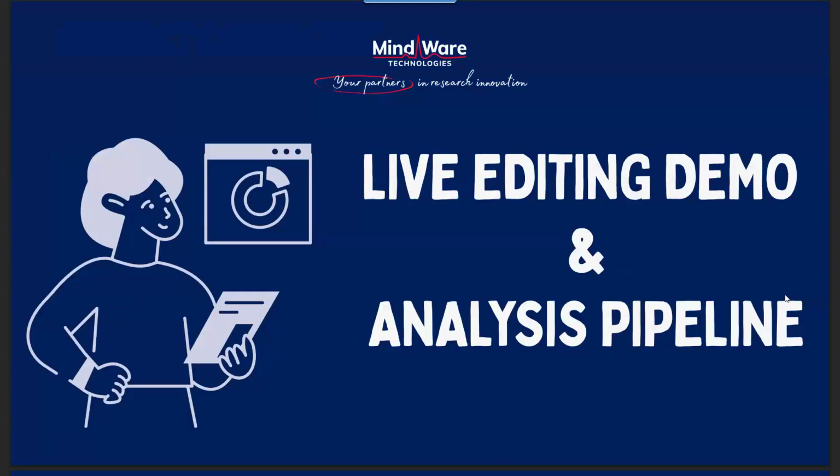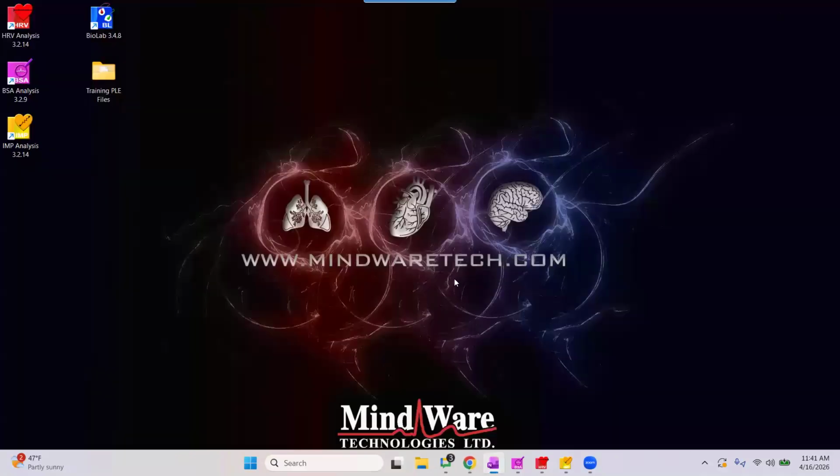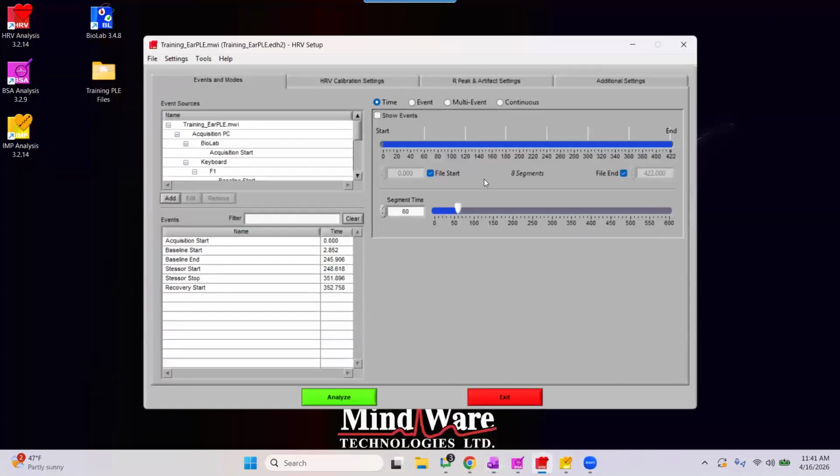So that being said, I'm going to pop out of our program for just a second and transition into the live editing of PPG. We are going to start by editing some PPG data in the HRV analysis program.